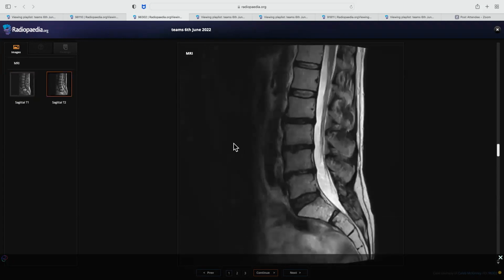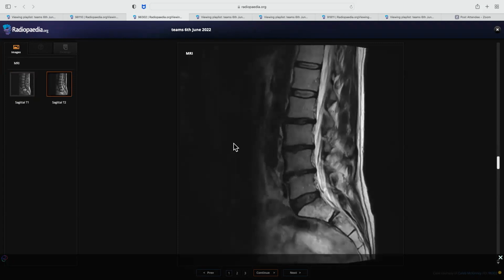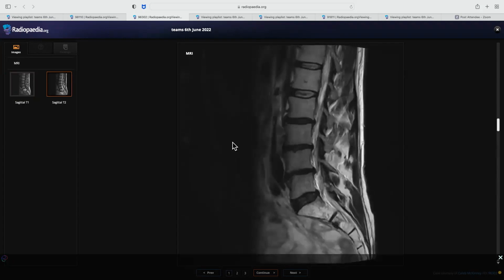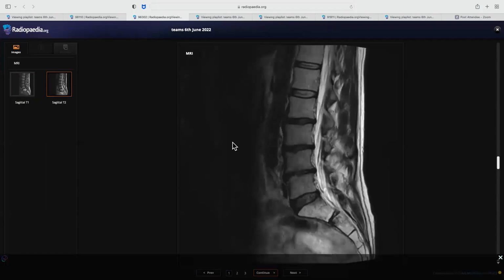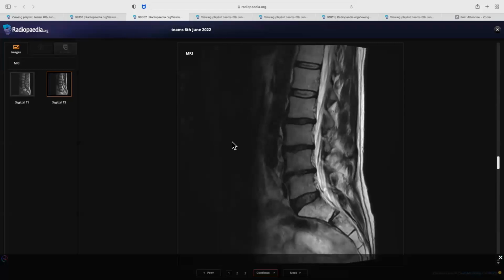And now I'm looking at the intervertebral foramina. They look fine to me. The cord is fine. And now this is a T2 weighted image. A similar marrow signal is also seen within the sacrum, exhibiting T2 hyperintensities, which is suggesting fatty replacement. So I'm assuming this must be due to some underlying radiation therapy.